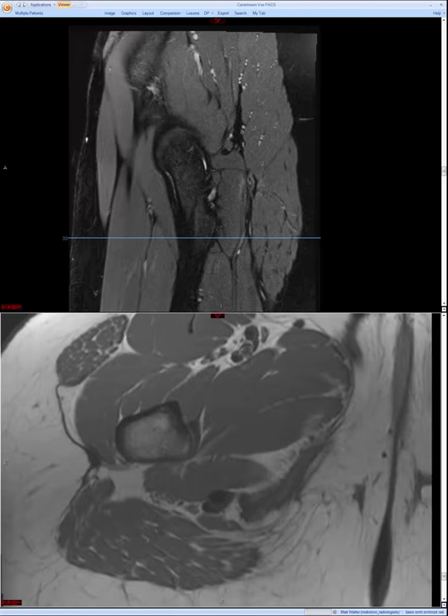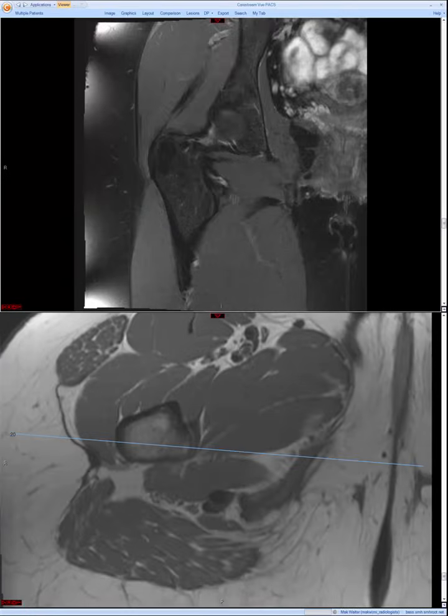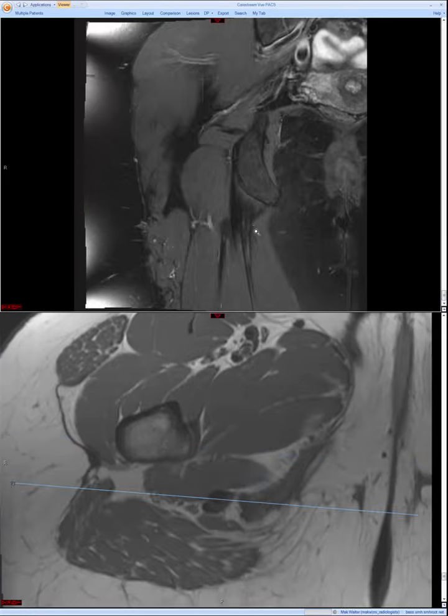Alright. If we are to assess the individual hamstring tendons, I think sometimes using the coronal sequence is helpful. Here, again, not terribly well shown, but I would argue that this is probably the semimembranosus. Here it's more lateral, and then this is the conjoint tendon. This conjoint tendon looks a little heterogeneous to me. It looks a little intermediate in signal. So this is one I would be tempted to call tendinosis here with regards to the conjoint tendon.